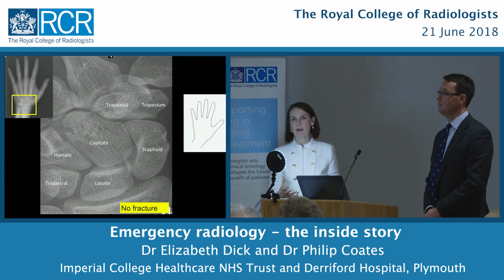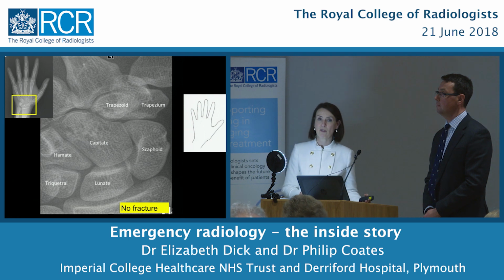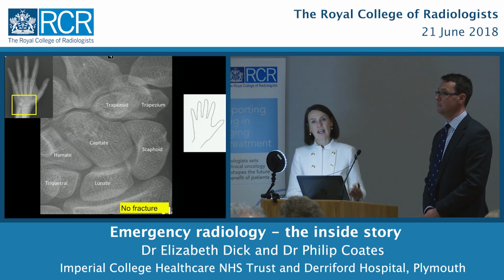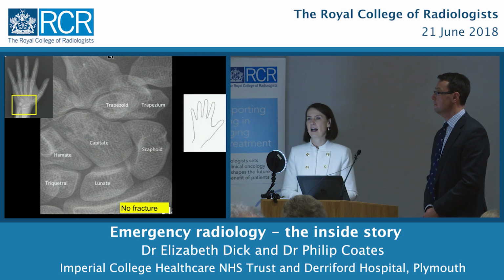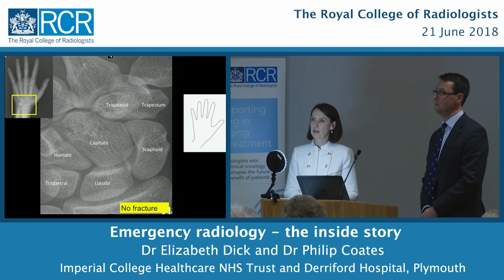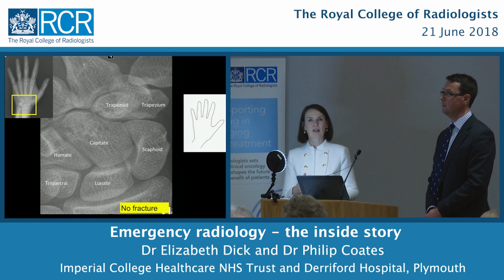And the reason why we care about it is it's the bone that is most commonly fractured, and it's the bone that when it's fractured can potentially have most complications. So I can't see a fracture on this patient, but what are we going to do now? Because they've still got pain. And we've got a couple of options here.